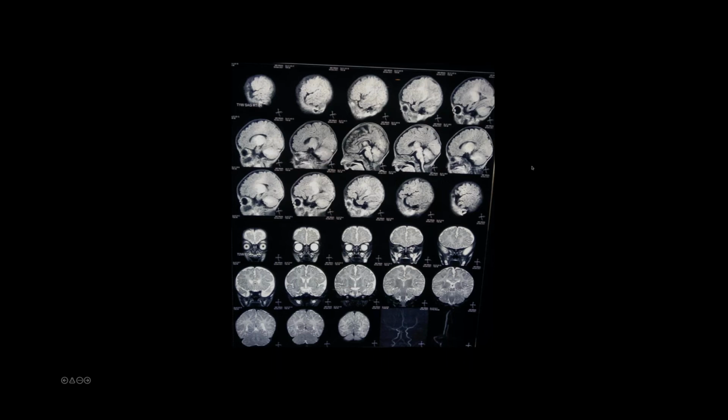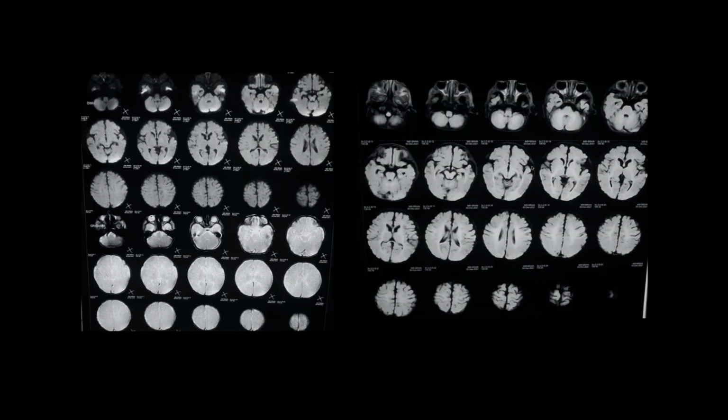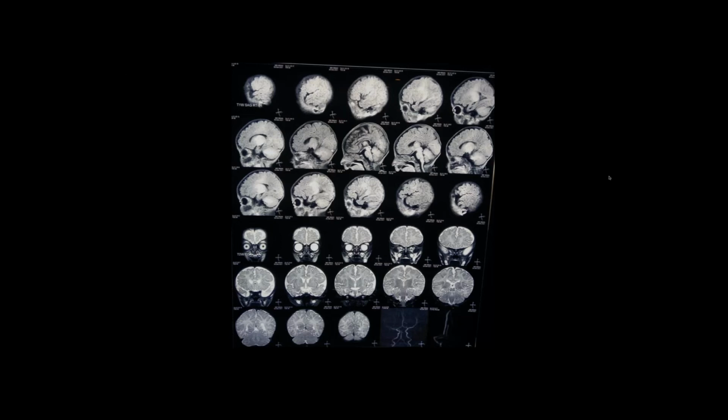Other than that, I cannot find anything else. For a term child at 6 weeks, hypoxic injury would be pretty unusual, only to have hypoplasia of the corpus callosum without any gliosis evident in other regions. The basic things are not clearly seen, but I cannot find anything else, at least on the films. If anyone wants to add anything to it.